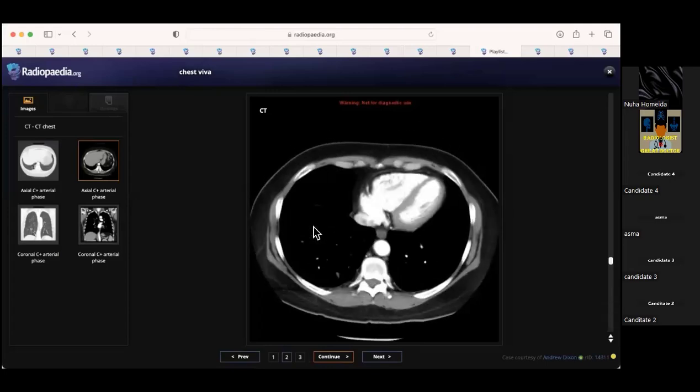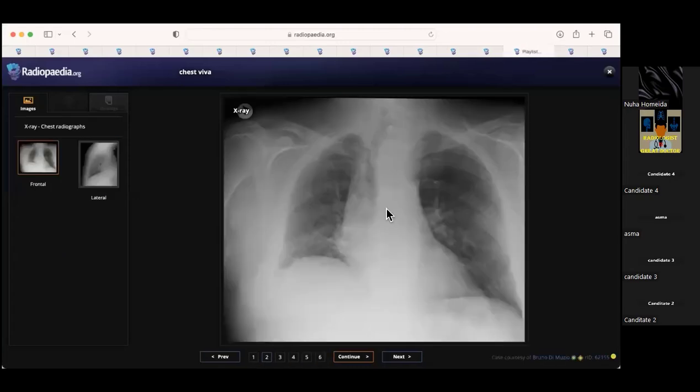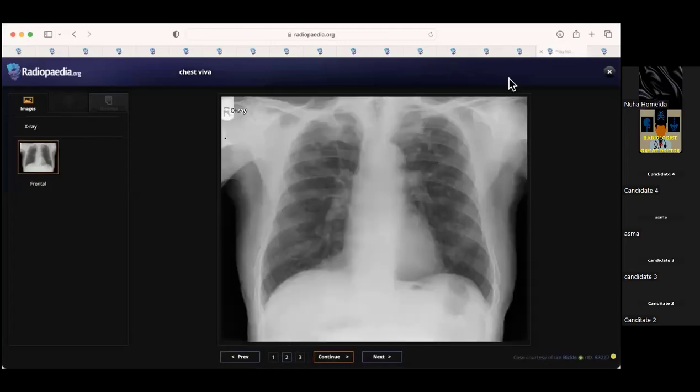So whenever you have a young patient with an atypical history or repeated infections, just look for a feeding vessel to suggest that this is sequestration. Again, that goes to MDT. And I think this is just a case of upper lobe or apical fibrosis with volume loss.